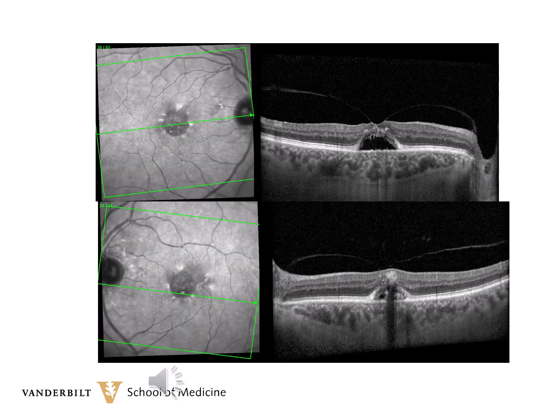And 5 years after the last set of photographs, you can see the right eye shows even more liquefaction, and the left eye shows the liquefaction and some hyperreflectivity in the middle of the retina, which is most likely some pigment migration. We do not have color photographs at this time. So you can see over time the area of liquefaction has become larger, and in some areas you can see more pigment migration.